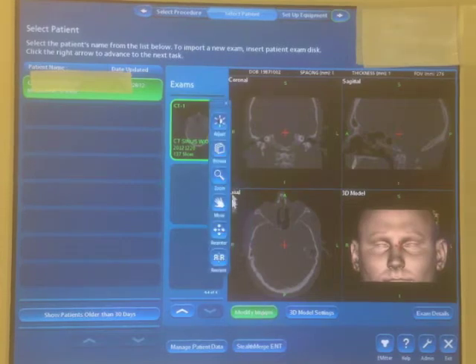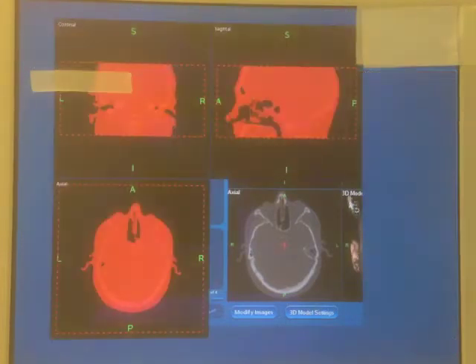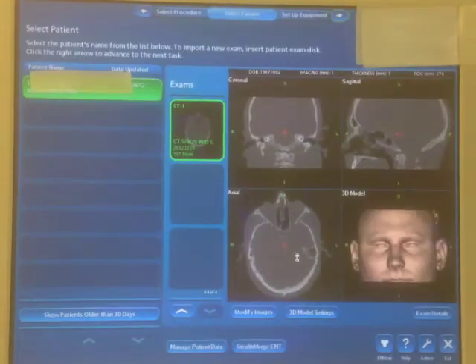At this point, the CT scan can be adjusted to your liking, whether changing the contrast, zooming in, or moving it to centered in the screen. The 3D model can also be adjusted by sliding the toggle bar. We can adjust it to remove the backboard so that only the face is remaining. There is no optimal setting. This will vary with each individual scanner.